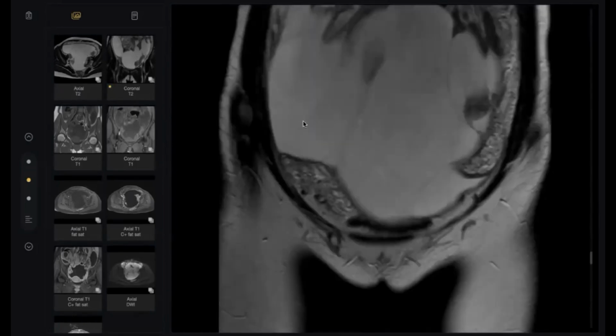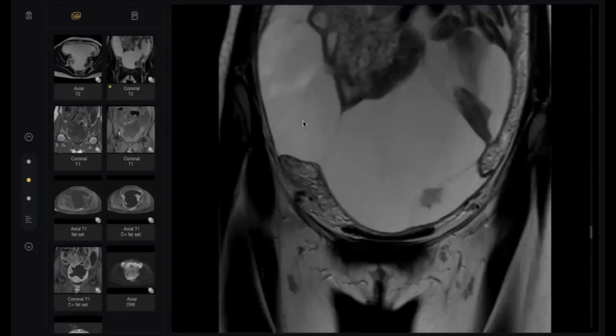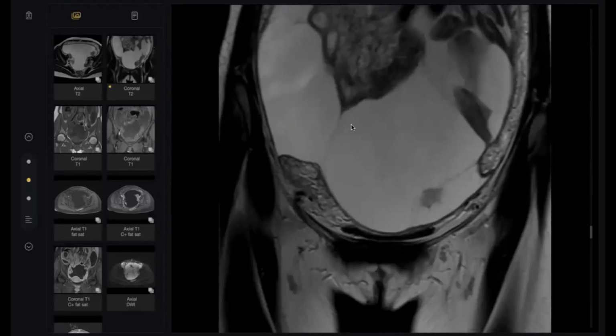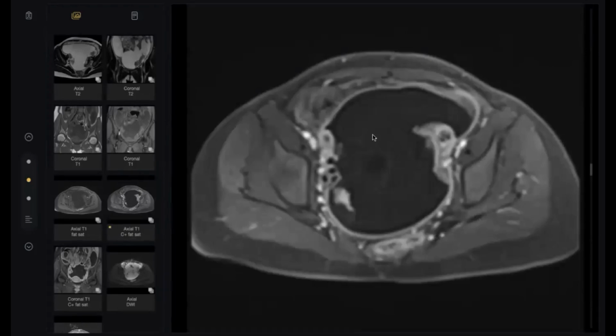See, my colleagues, it is difficult to be a large cystadenoma or cystadenocarcinoma, despite you showing both in your differential list. This is most likely ascites, ascites due to this peritonitis.